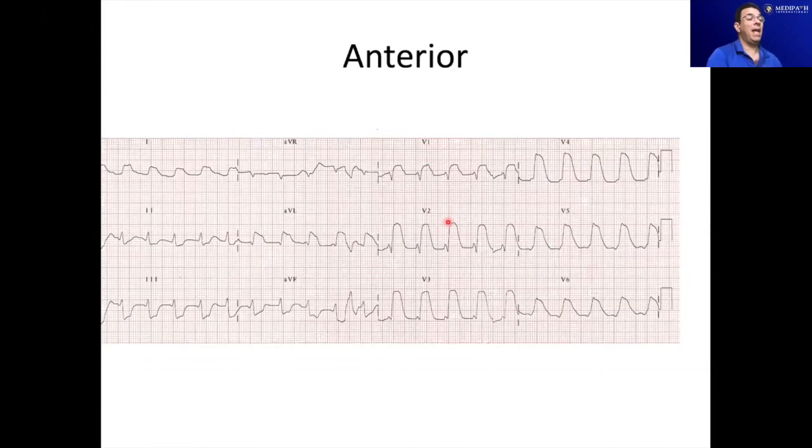And this is an example of anterior ST elevation, which you see in V1, V2, V3. The QRS complex ends, and the first thing you see is this big elevation. This is classically called the tombstone EKG. It's a high risk lesion because it's going across the whole anterior part of the heart. You also see some lateral ischemic changes, and then you have those reciprocal depressions in the inferior leads. So that's an example of an anterior ischemia.